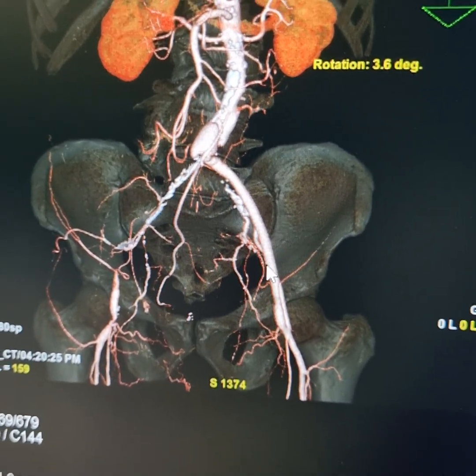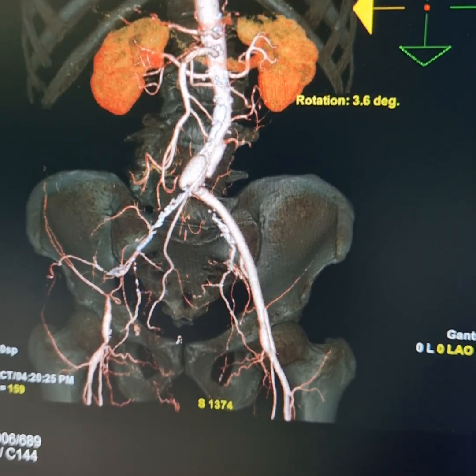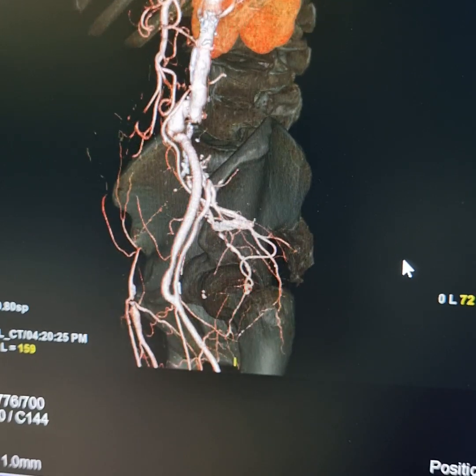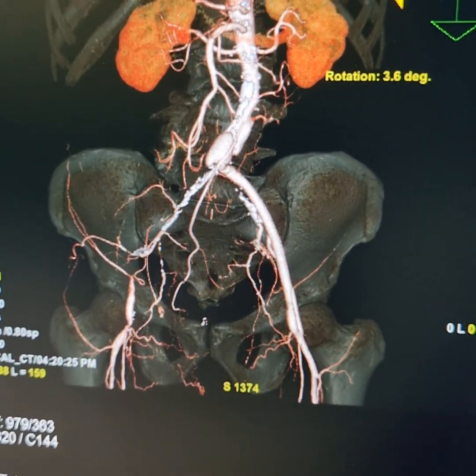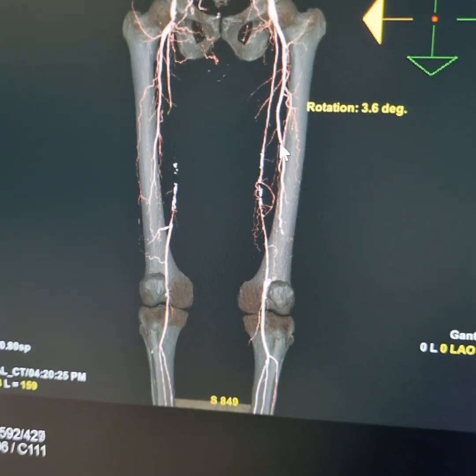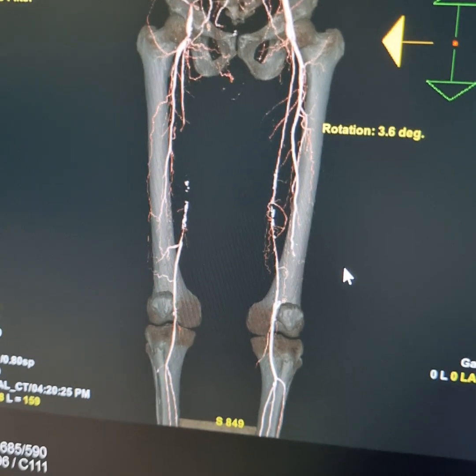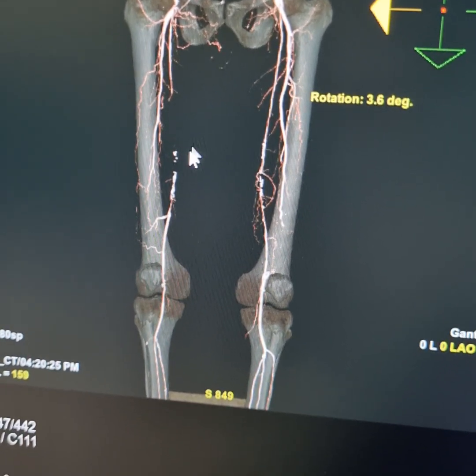Now this is the graft here. This one is the site of the occluded left common iliac artery. One must do the reporting from the CT angiogram and not the 3D images because these may be misleading. The partly calcified atheromatous plaques may give the false impression of a patent lumen, like this one here or this one here.